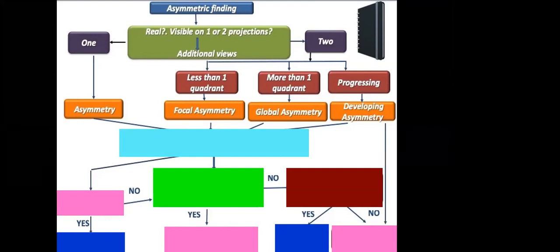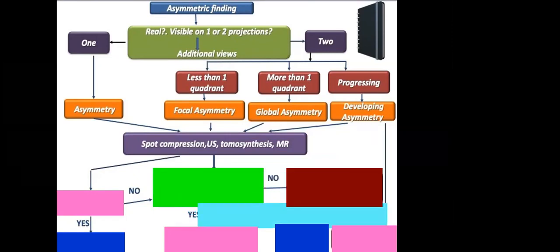Apart from additional mammographic views and ultrasound, what else? Spot compressions or other mammographic views, ultrasound, tomosynthesis or MRI.